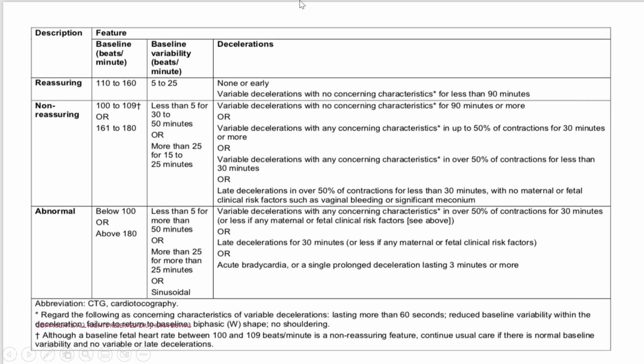And you can see that this is actually the intrapartum monitoring. So intrapartum CTG and antepartum CTG are a bit different. Intrapartum CTG, we actually classify based on three things: one is the baseline heart rate, second is the variability, and third the deceleration. We don't calculate the acceleration here. But if it is an antenatal CTG, in that case, we include acceleration. So this WHO classification is basically on the intrapartum monitoring, that is the intrapartum CTG.